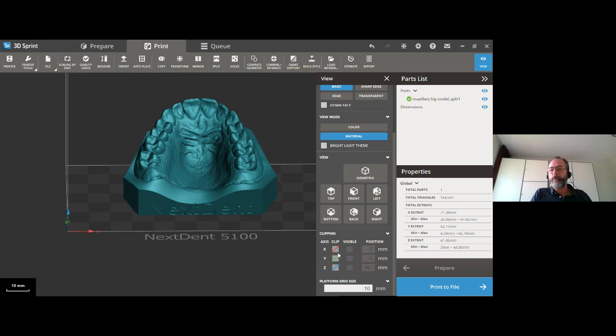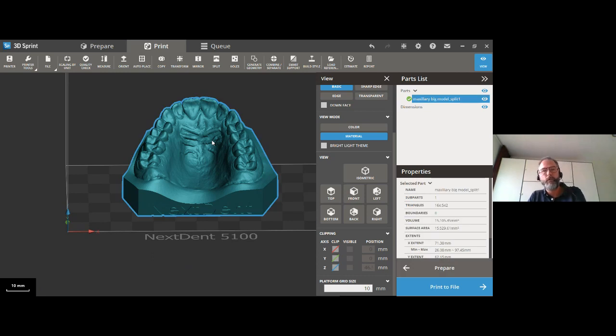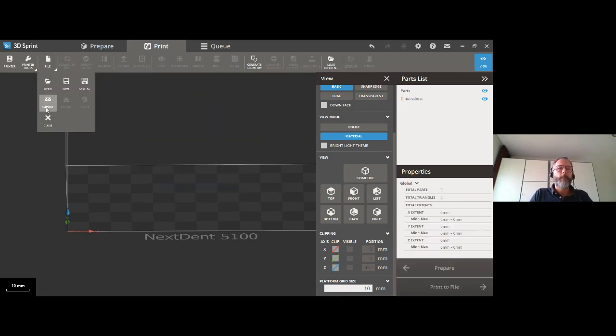That was the orientation. You can also, of course, use the other axis, but here for what we call the cupping problem, this is a nice feature to look at. Look at the model, and by orientating it slightly differently, you can overcome this small issue.